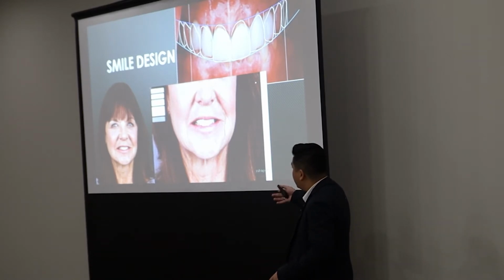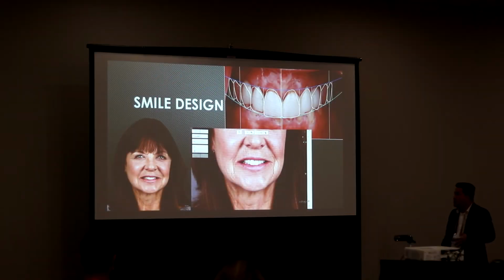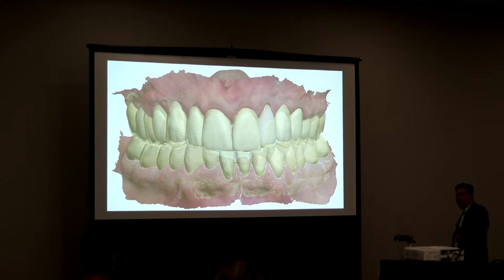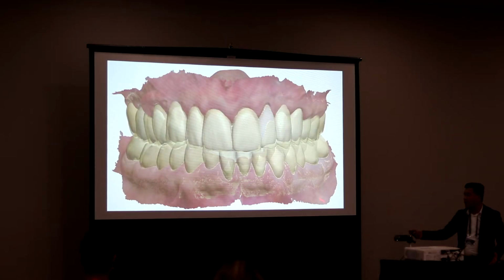And we always start with a smile design. The reason we do that is it's a very simple way to get a starting point for where you want to start. So we use this 2D smile design that's patient excitement and a roadmap for what our ideal endpoint is going to be. Then I'll pair that with a 3D digital diagnostic. What I like a lot about these 3D digital diagnostics is it allows me to play, to really see what the final product will be, where we may need some prosthetic reductions, where we may need to use crown lengthening, for example, orthodontics, whatever else.